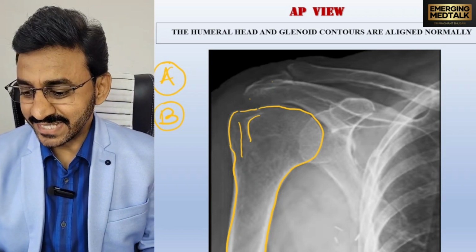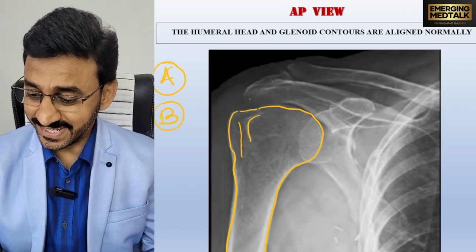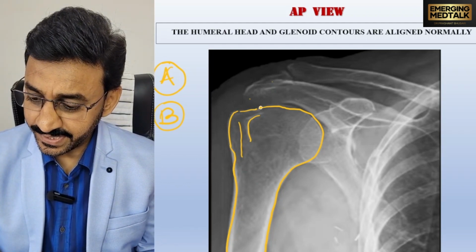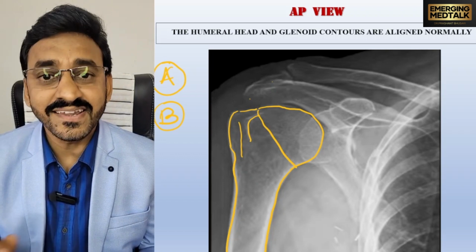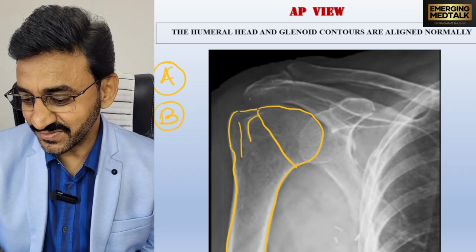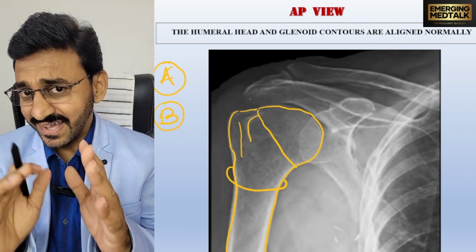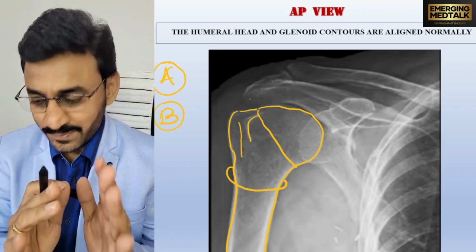Simultaneously there are two important necks, where the head separates from the upper end. This is the anatomical neck, and where fractures are common is the surgical neck of the humerus, where the axillary nerve may be damaged.